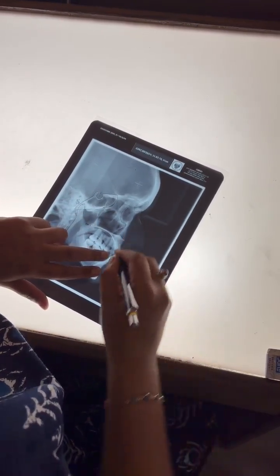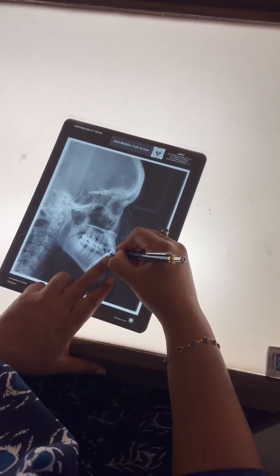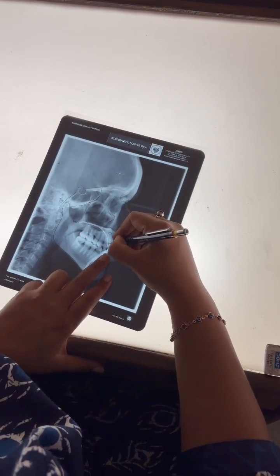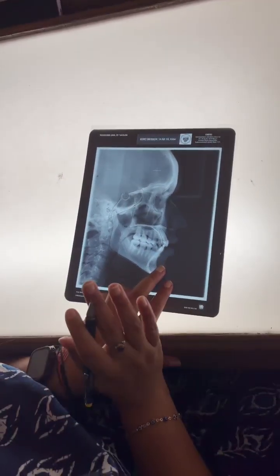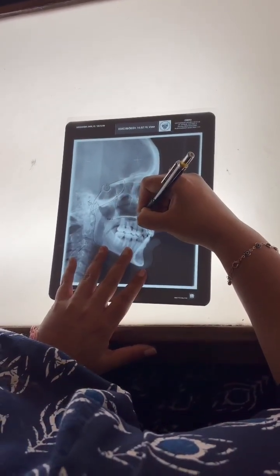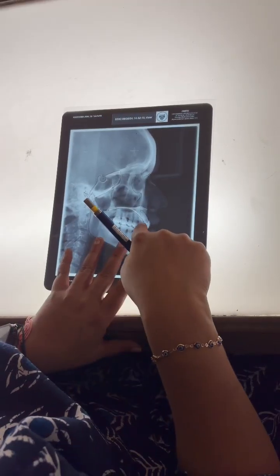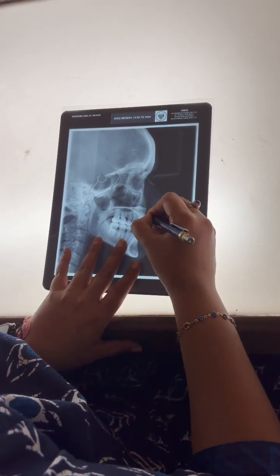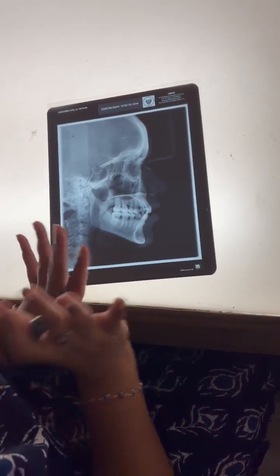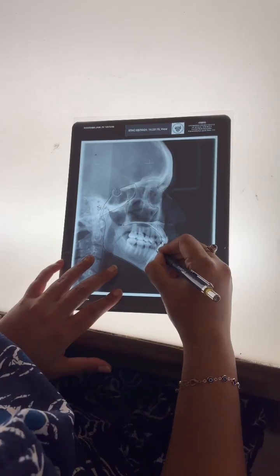Can you see your incisors here, all of you? Your central incisor. Please draw it how you have learnt it in DADH. Okay, even if you're not able to appreciate it, you have to draw it anatomically in that way. So it becomes your central incisor point. This posteriorly will extend, joining to your central incisor. Anteriorly it will come here, the bone. Okay, basically it's a cavity-like structure. Upper incisor, next we have lower incisor. Lower incisors.